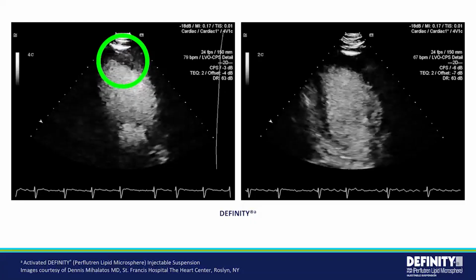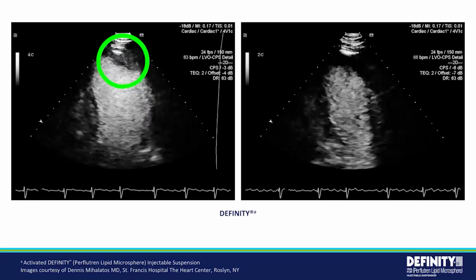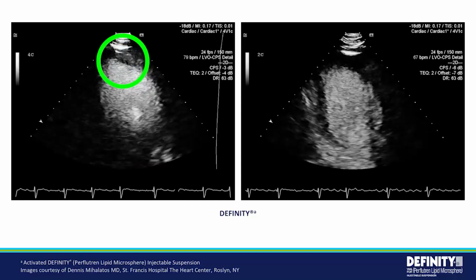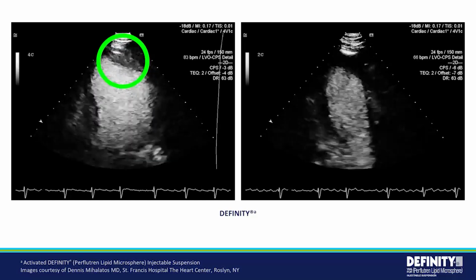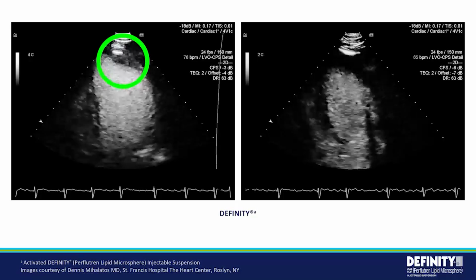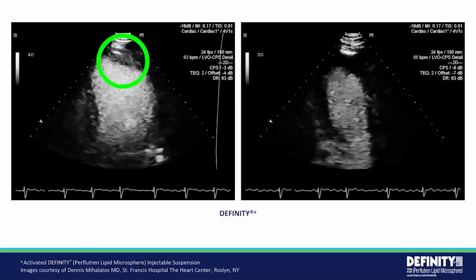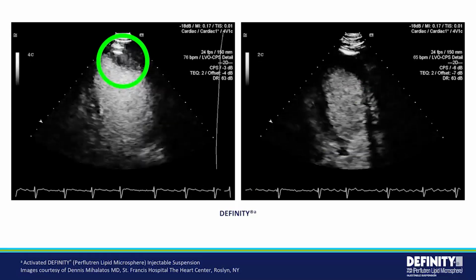This one is very obvious. However, at times, these thrombi could also just affect the apical views, and all you could see is a defect, a lack of DEFINITY in the apex, and there's flattening of the apex. This flattening is slanted, but other times the apex is just flattened and you could never get a nice pointy apex. Without having seen this pattern before, you are not going to make the diagnosis.